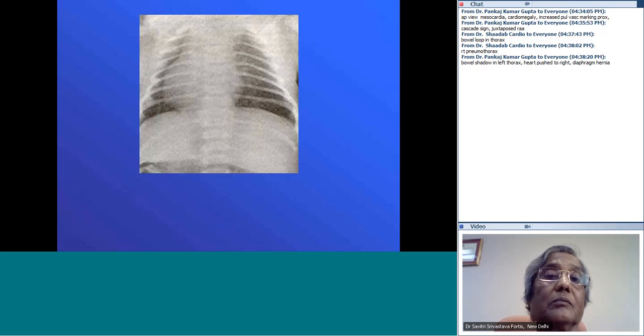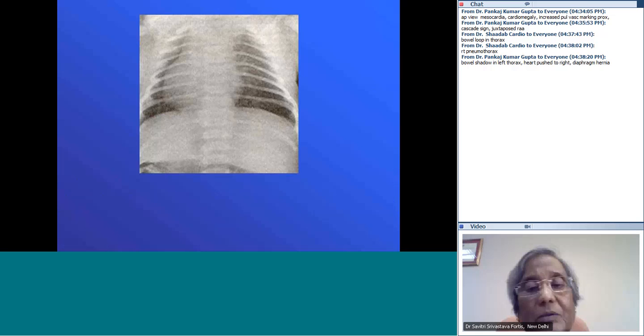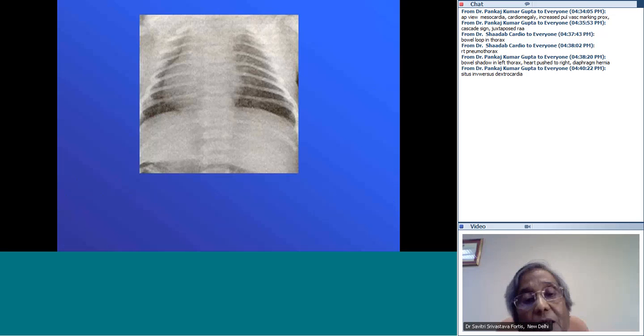I'd like more people to attempt the X-rays, so that it becomes an interactive session, but only one or two people are answering. Okay, at least two people are there.